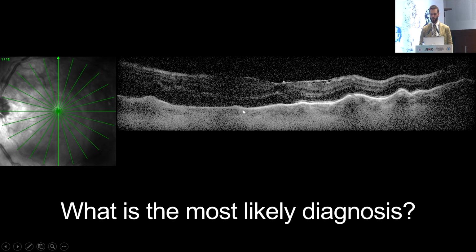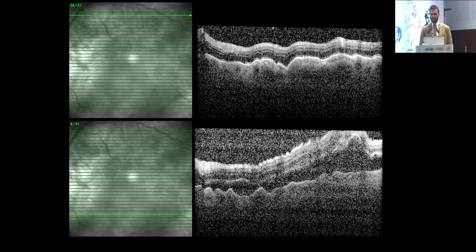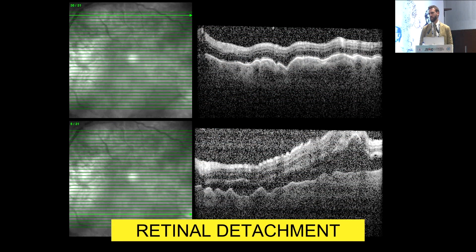Now, here the choroid is very thin, so I wouldn't worry about VKH in this case. It could be anything of these cases, but it's actually a retinal detachment that's causing spreading of the photoreceptors, and actually the patient has kind of Matsuo syndrome because the pressure is high.